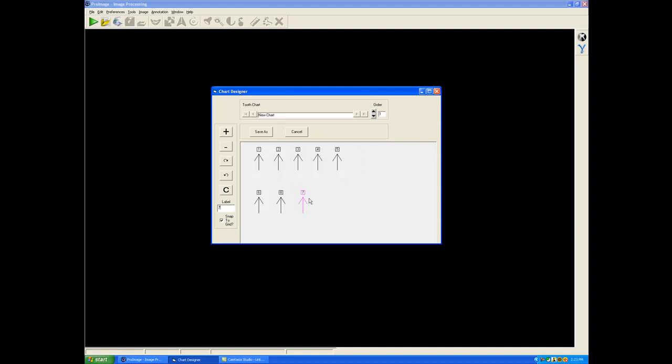And it is important to note that you're going to want to rotate these positions so that basically they're correct. It should be like that. To our left, pointing towards the front, top, portrait pointing towards the front as well. And then we can save this and give it a name.